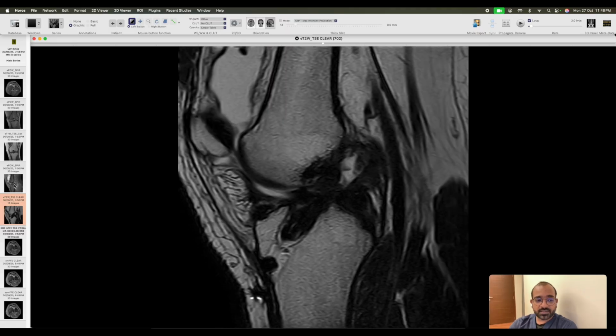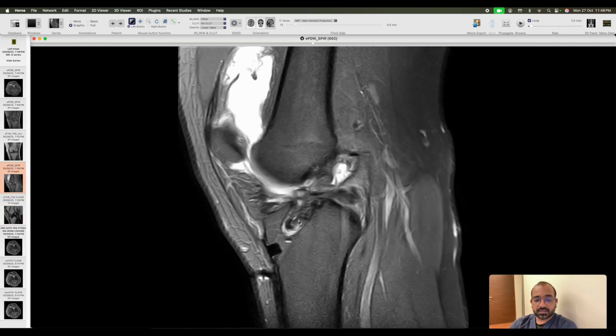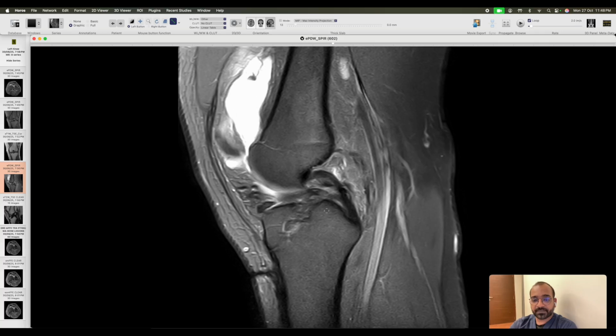That is okay. But what is happening inside this tibial tunnel is there are cystic changes, graft ganglion formation. And here, these cystic changes are cystic degeneration of the femoral half of the graft.